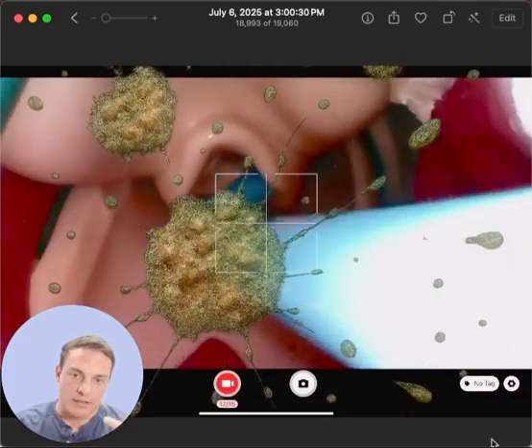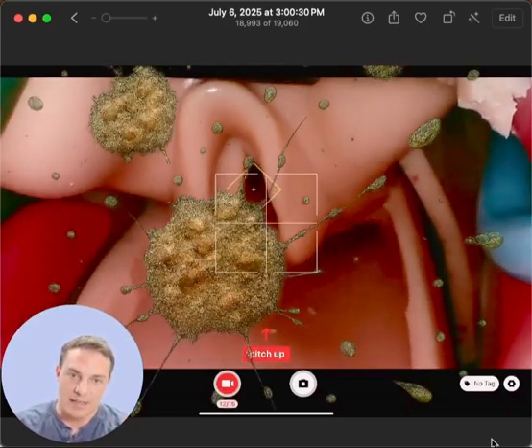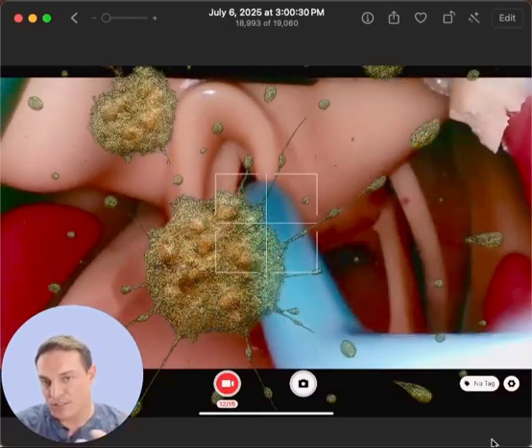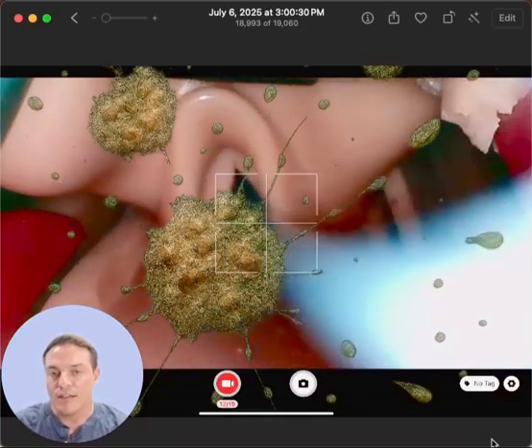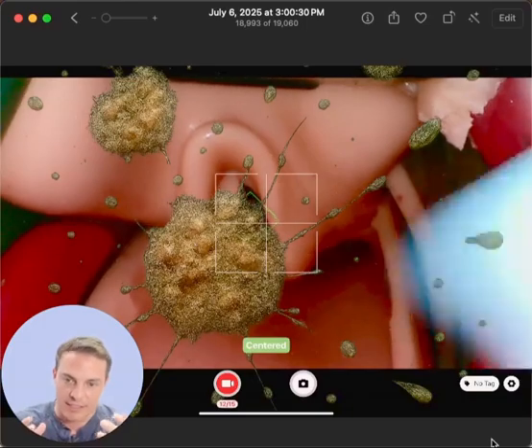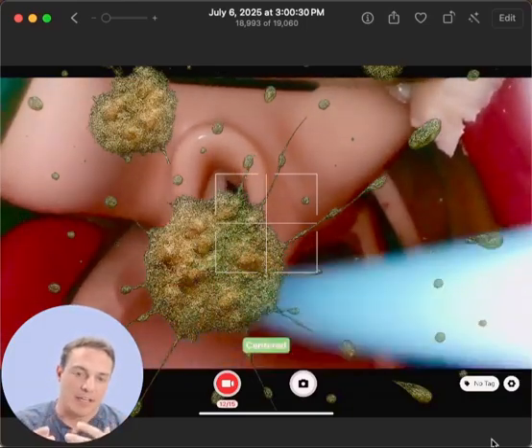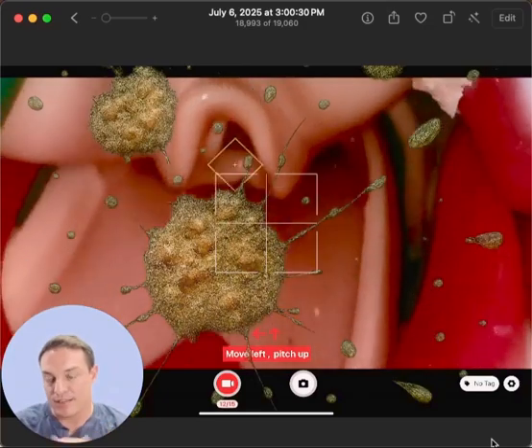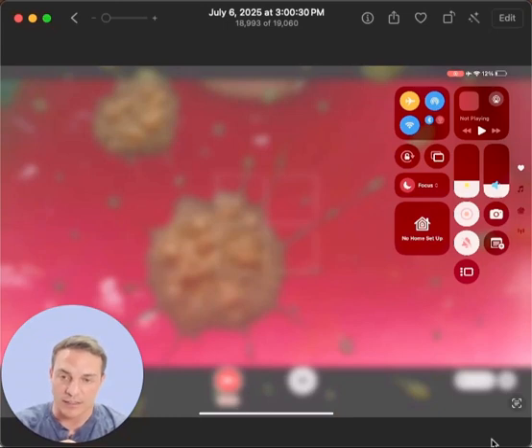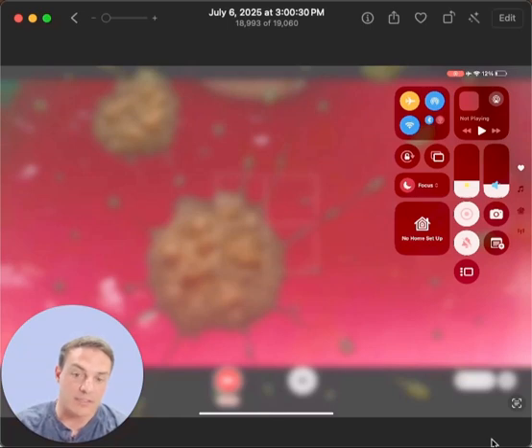The other thing on top of this that gets interesting is being able to add in the training model in order to get past these obstructions. So how can one harness that targeting system? Can we train a model that not just uses strict static images? Can we get something in a dynamic environment where you can still get that procedural guidance? Now, this is an overlay, right? So this is not illustrating that point, but the next step would be to train that model to do so. I think this gets very exciting because this pushes us into that realm of taking low fidelity mannequins, very cheap tech, and outfitting folks with things that would cost hundreds, if not thousands of dollars, right?